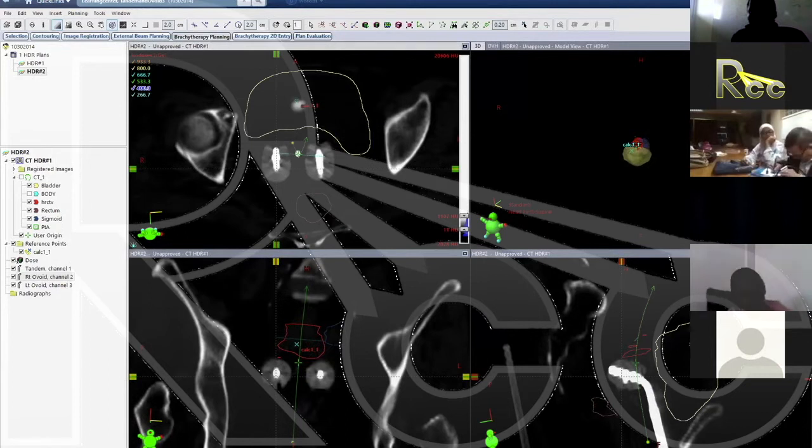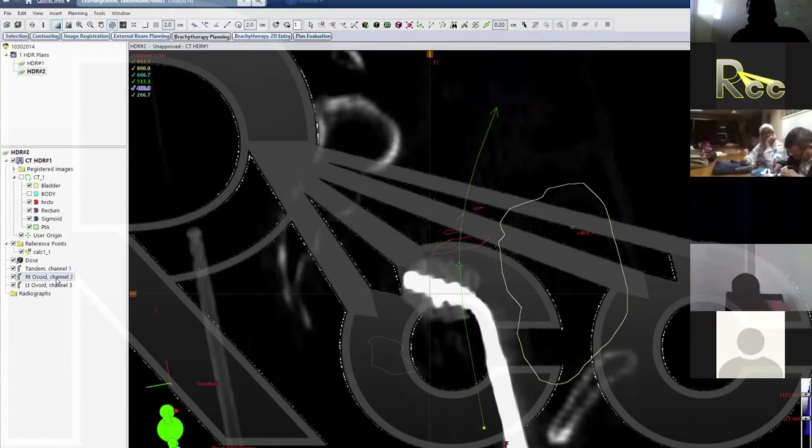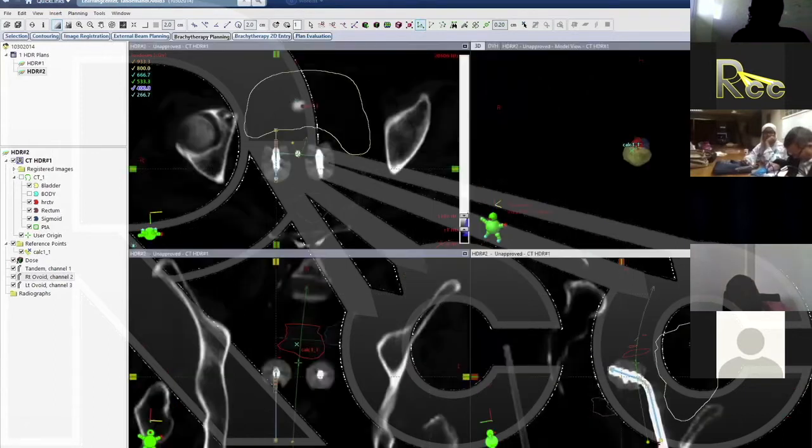Again, I'm going to make that large, select the right ovoid, and then I'll go ahead and digitize that ovoid. Again, we're not going to load past the bend, but we are going to digitize well past the bend. Okay, so that, and then we'll check in our bottom left image.